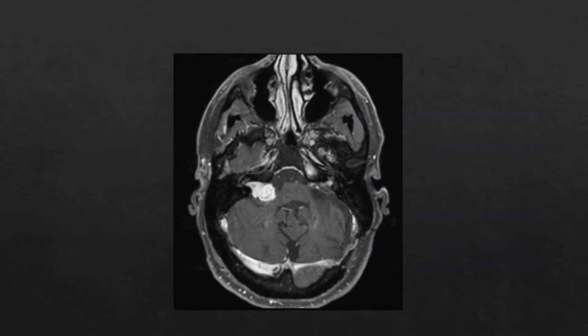Next, we have a patient with bilateral CP angle cistern masses and involvement of the IACs.